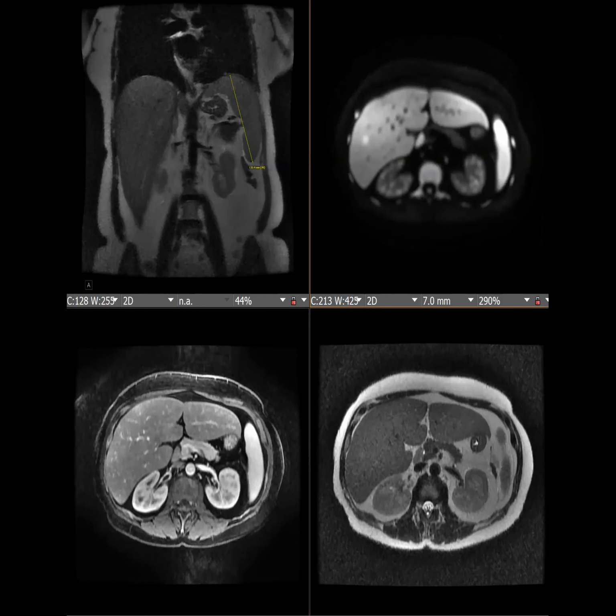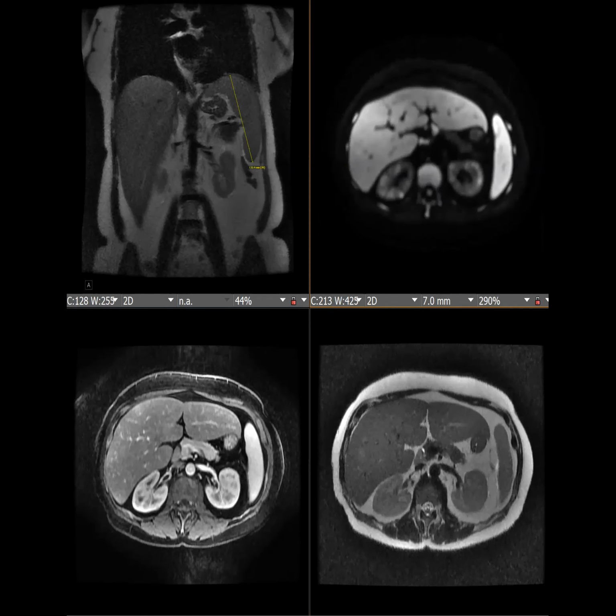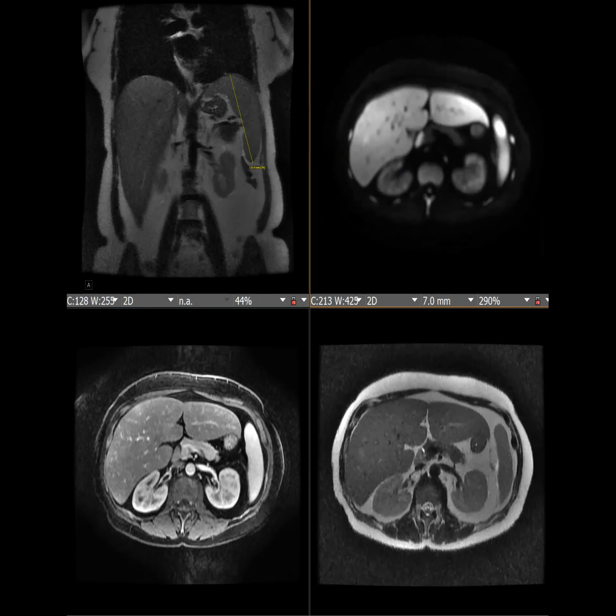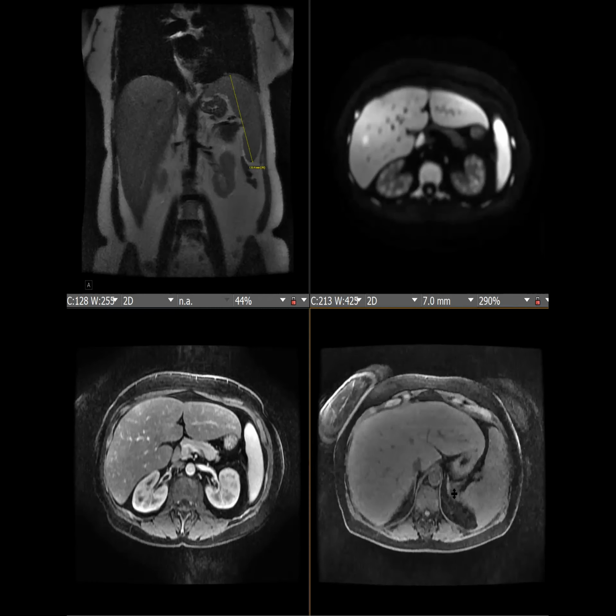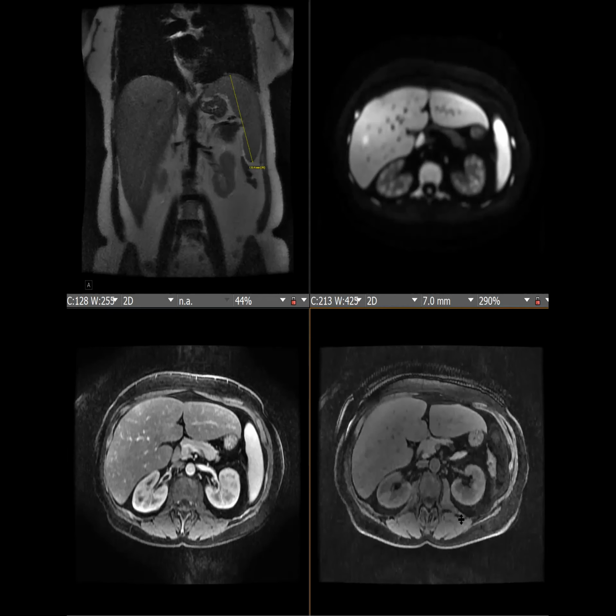That's a great example of an infiltrative process that just blends in. Can you show us the T1 pre? I had a case like this, lobular breast cancer mets, diffusely spreading. Wow, you can't even see it there.